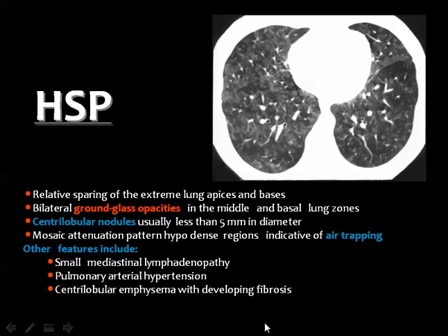If this appearance is a chronic presentation, then you put hypersensitivity pneumonitis at the top of the differential diagnosis. One may ask why I do not consider this usual interstitial pneumonia: because of the absence of traction bronchiectasis and absence of honeycombing. Why don't I consider this non-specific interstitial pneumonia? Because there is no traction bronchiectasis. Okay, you know what I mean? Some of the clinicians in Egypt consider that most of the cases diagnosed as non-specific interstitial pneumonia are actually hypersensitivity pneumonitis. There is a great overlap between both, and you should investigate the patient very thoroughly in order to reach the specific allergen that has caused the disease.